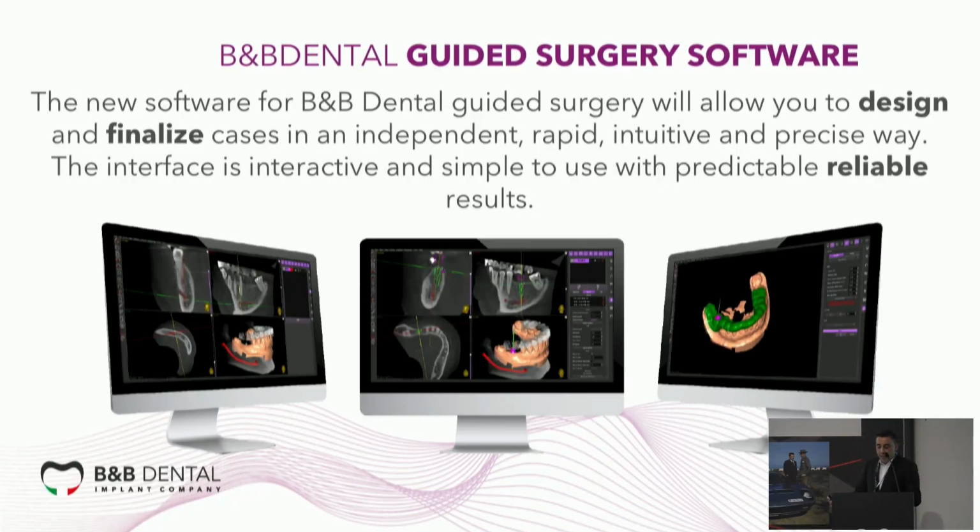The new software for B&B Dental Guided Surgery will allow you to design and finalize a case in an independent, rapid, intuitive, and precise way. You can download this software from our website and manage everything you want. You can import the DICOM files, project your case, and finalize your surgical guide. And if you have a 3D printer, you can even print your guided surgery. It's very easy to use, and the learning curve is very user-friendly.